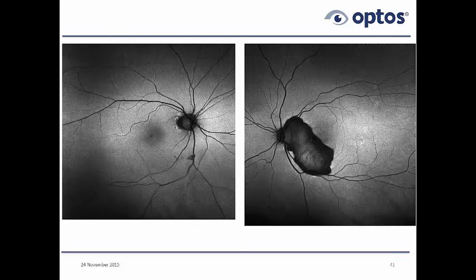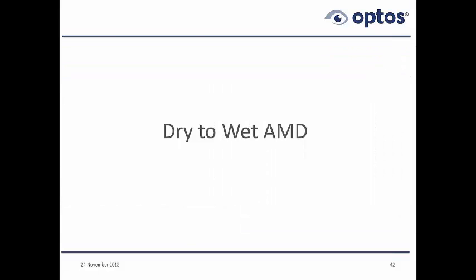Okay, comparison of the two eyes. Sometimes drusen, as we saw in this right eye, can occur in mid and far periphery with not much going on centrally. But of course, in the same patient, in this case in the other eye, we can see that indeed this is the peripheral drusen, drusen here, which is sort of temporal to the fovea. These are somehow related to the lesion, which became from dry macular degeneration to wet macular degeneration. It's sort of interesting to see this kind of a pattern.